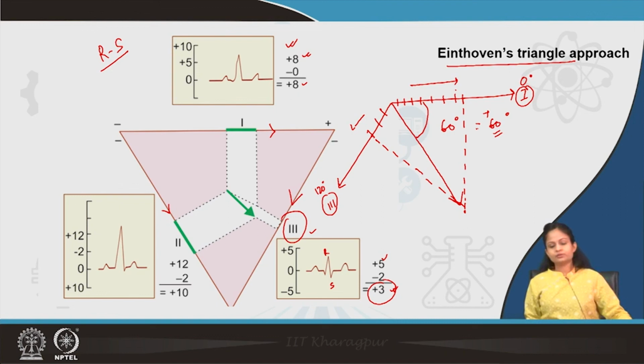So, it is lying in the normal range. As I told you, you can take any leads. If you want to take lead 1 and lead 2, you can go with lead 1 and lead 2, but conventionally, for a safer, more accurate and better way, we just take lead 1 and lead 3, and it is good. Usually it is easy for the students to calculate.